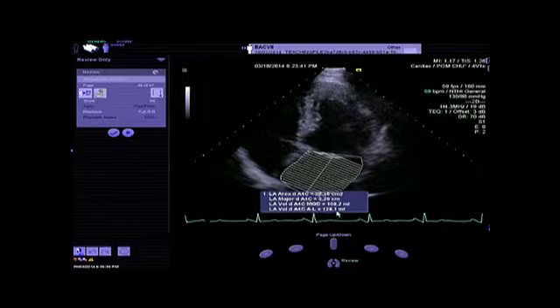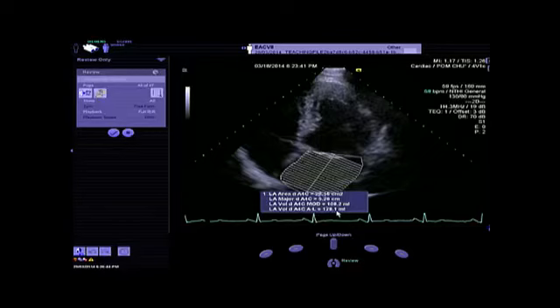This means that it is a severe dilatation. This means that when we have a cutoff greater than 40, it is associated with some morbidity. And if it is more than 60 milliliter per meter square, it is associated with the occurrence also of cardiac death.